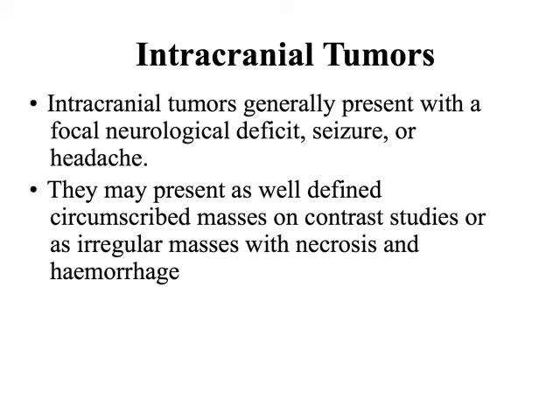Okay, let's talk a little bit about tumors. Intracranial tumors generally present with a focal neurological deficit, seizure, or headache. A lot of times these patients just present with a headache, but they have a history of lung cancer or some kind of metastatic disease. Typically they may present as a well-defined circumscribed mass, but that's with contrast.